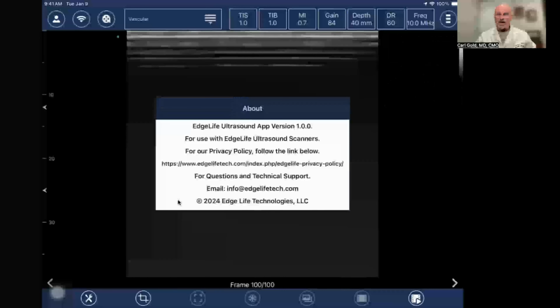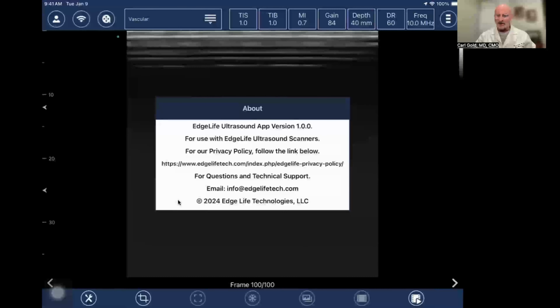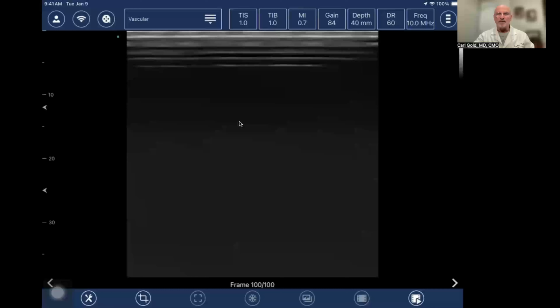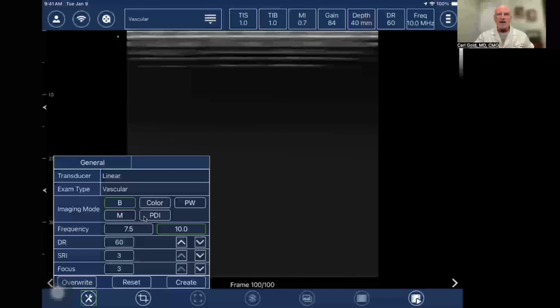We are able to safely state that there is no personal information stored or obtained by the probe or the app. And of course, we can use the logout feature should we be in the username and password mode. Currently, we're in an automatic setting so that any user can pick up the probe and iPad and begin using it.